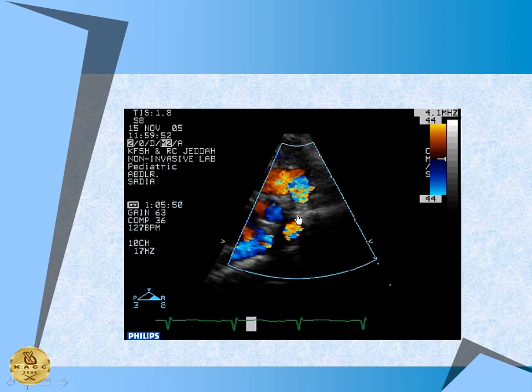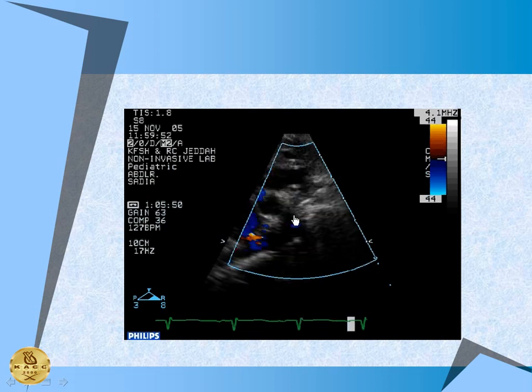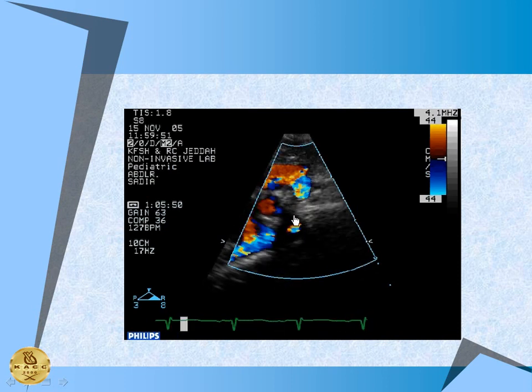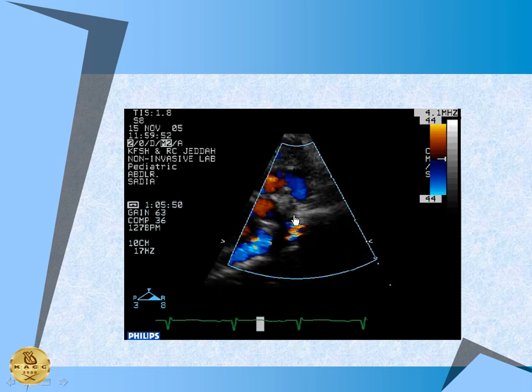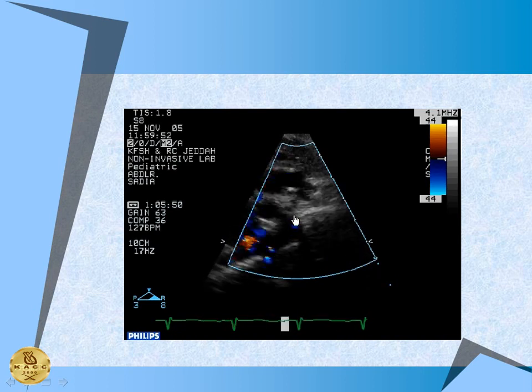It's important to get this piece because the surgeon may ask you, what's the distance? Is he going to need to put an interposition tube? Usually this is very uncommonly done now. Most surgeons will be still able to pull out that abdominal aorta or that thoracic aorta up to the arch.